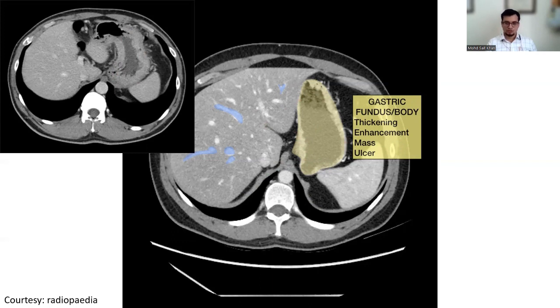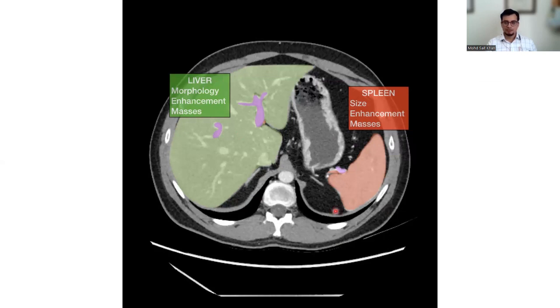Okay, so these are the important pathologies you are going to see in the CT at this level. Appreciate the spleen, which is concave or convex, and it should always be looked at for size. Usually the spleen is enlarged in a few situations, splenomegaly, and in a few situations it may be shrunken, like in autosplenectomy cases and sickle cell anemia. There is no spleen at all.